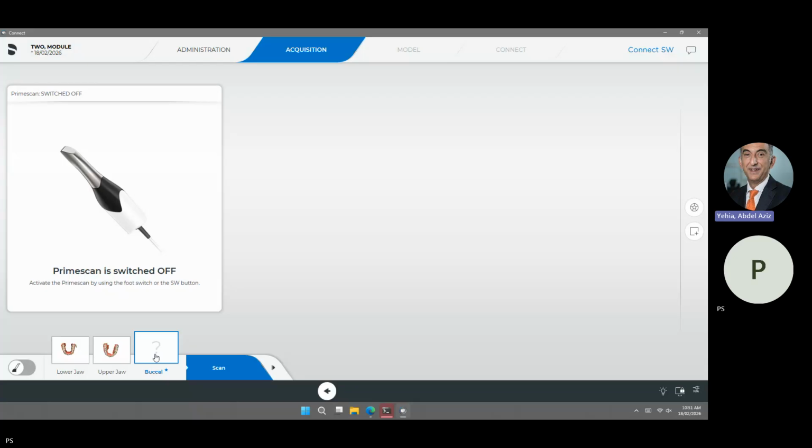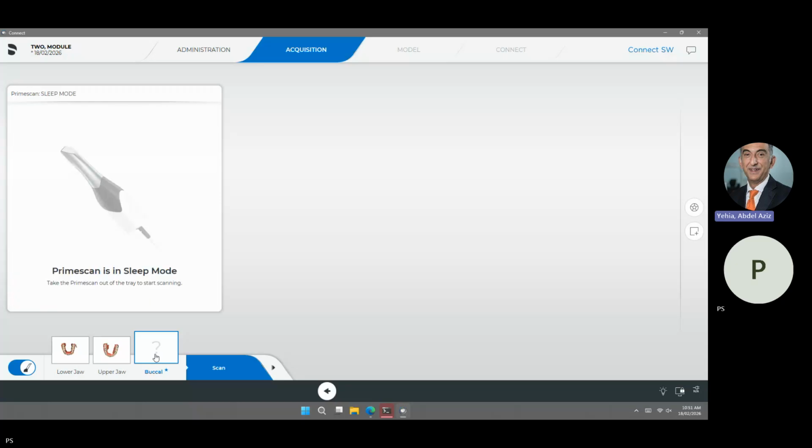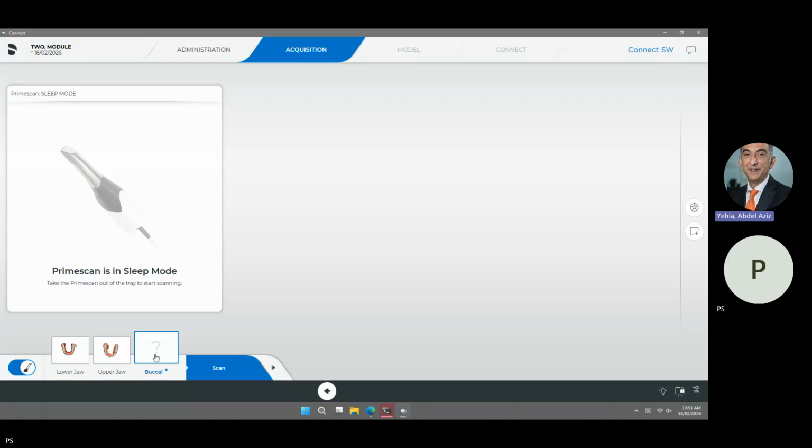Please check where the foot pedal is. And if I click it one time upwards with my foot, the camera starts. If I click it again one time upwards, the camera stops. So always, so now it stops, now it's on.